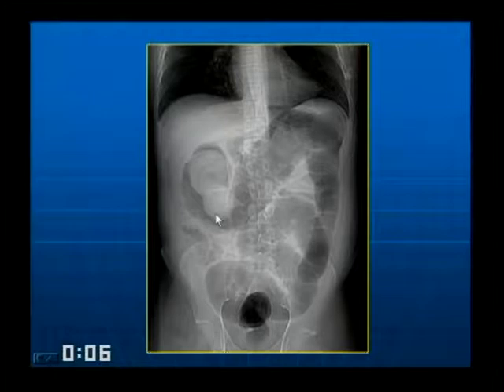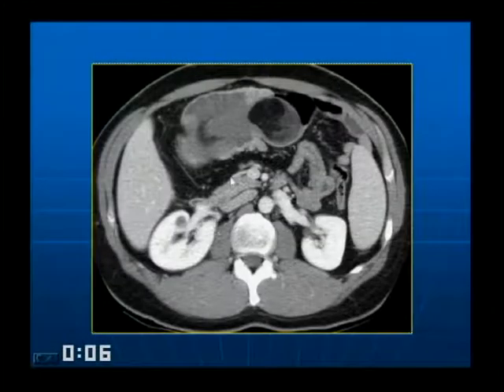Duplication's one idea. What would be the most common cause of a colocolic intussusception? Right, lipoma, right? Certainly the most common. And here you can see on CT the intussusception. We saw in the previous lectures some examples. Claire showed you some intussusceptions in the small bowel with CT and barium, and the same concept over here.